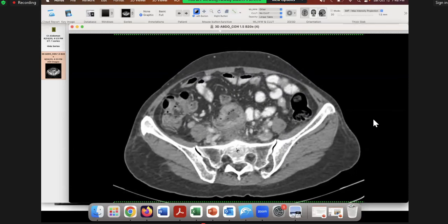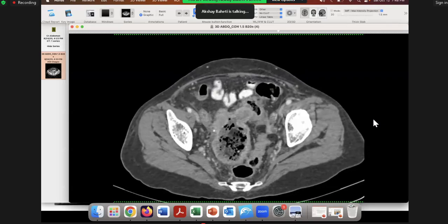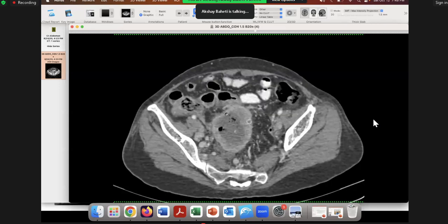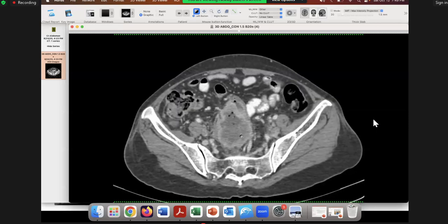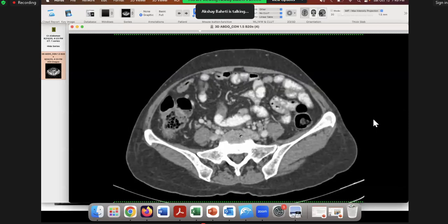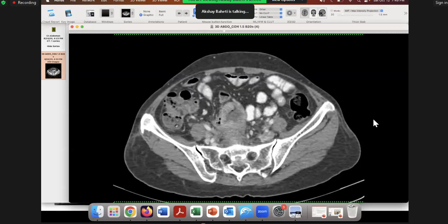Okay, so see in the pelvis, there is rectosigmoid or the sigmoid basically. Sometimes if the transverse colon is very redundant, it can go to the pelvis. Otherwise, what loops are in the pelvis? Ileal loops, right? Yes, sir. Sometimes the appendix can be sort of pelvic. So those are the places where you would look if you are seeing something which is bowel-like in the pelvis. Okay, so here's the cecum.